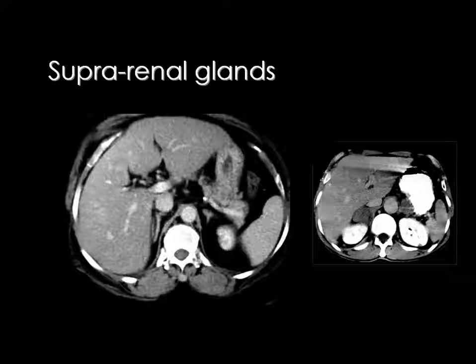Then we used to continue scanning the chest until we can see the suprarenal glands. Because, you know, in cases of bronchogenic carcinoma, common site of metastasis is the suprarenal glands. And you may say that not every patient had a bronchogenic carcinoma, but actually we have a problem to monitor the cases while they are examined by a specialist. And we usually depend on the technician.